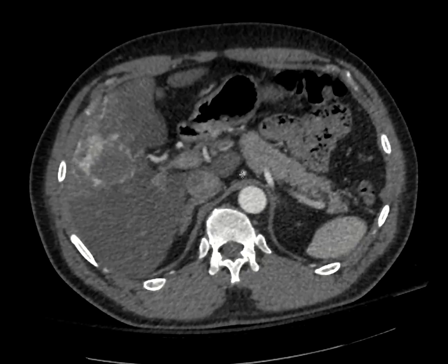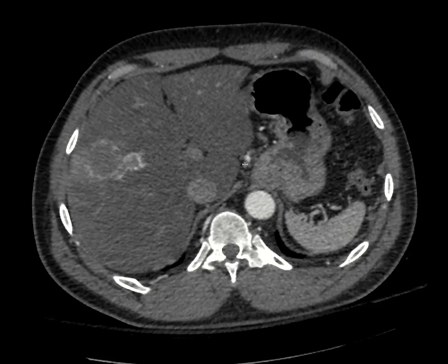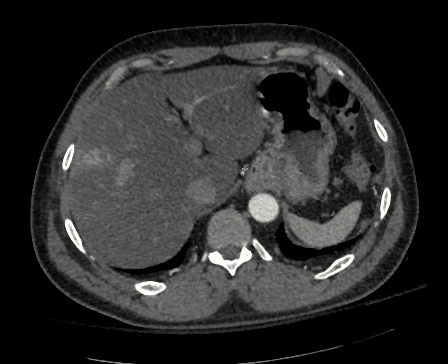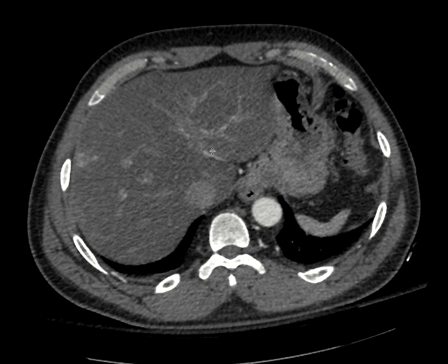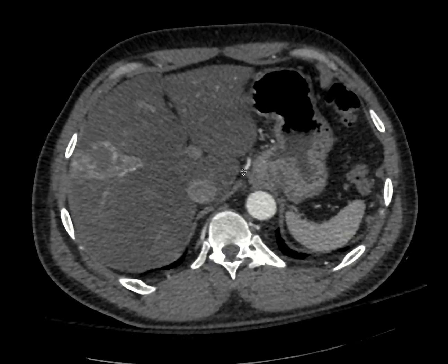Let's follow it up. We come up further, and then we can see in the gastrohepatic ligament here that there's this vessel that crosses into the liver, and so this is our replaced left hepatic artery. If this patient also had a left hepatic artery that was coming off of the common hepatic artery or the proper hepatic artery, then this would be an accessory left hepatic artery, but since we didn't see one, this is a replaced left hepatic artery arising from the left gastric artery.